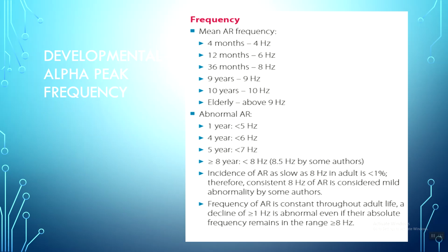So this is developmental neurology, pediatric neurology. How do you know that it's alpha if it's not in the alpha range? Because it's sinusoidal, and that's when we get into morphology. This is where EEG becomes really beautiful. It's like tea leaves. It's very interesting to look at bumps and say, ooh, this bump means this. So when we hit 12 months, when we're 1 year old, our alpha should be at a 6.